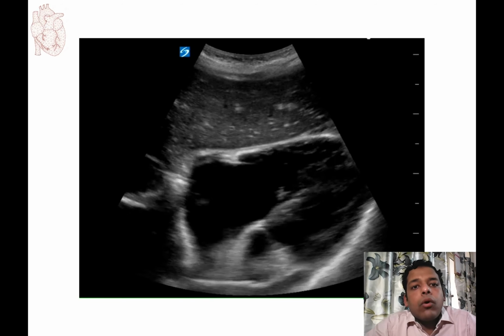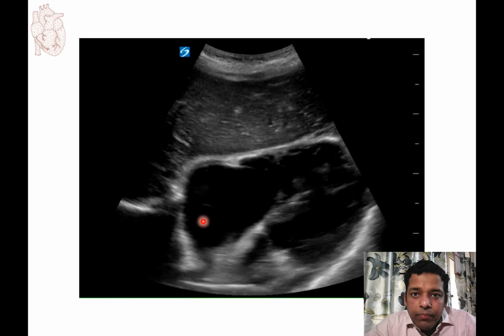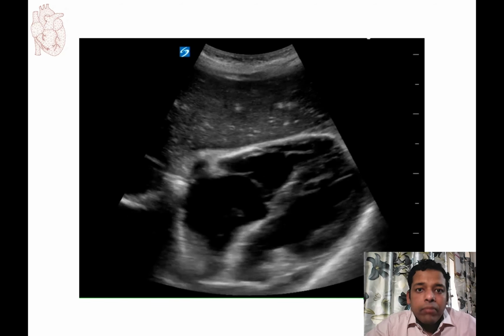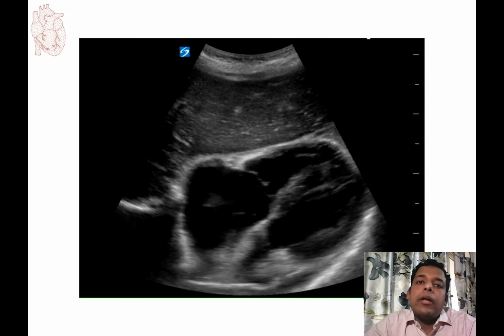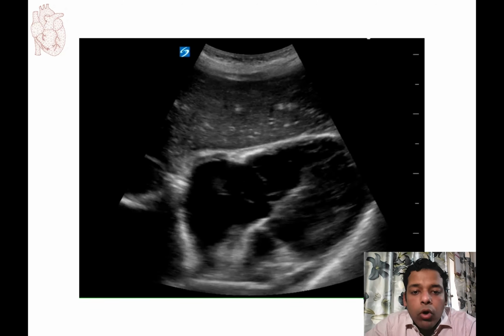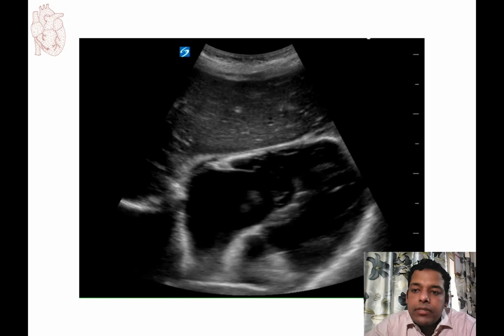This echo also shows a mass in the right atrium. This mobile mass seen in the right atrium is a clot in transit. Thrombi from the lower extremity deep veins must go through the right atrium to reach the pulmonary circulation. They are mobile, have a characteristic popcorn or snake-like appearance, and almost always are associated with pulmonary embolisms.